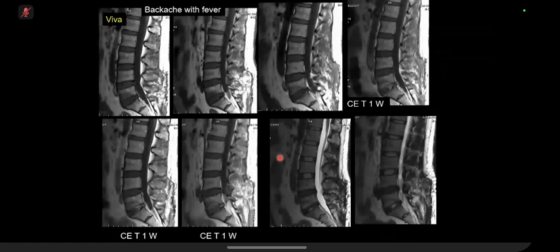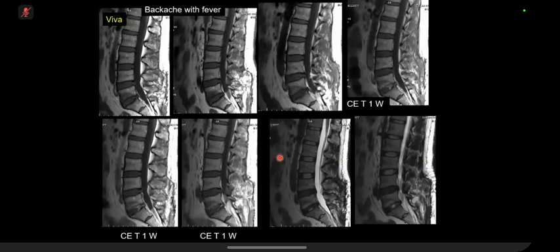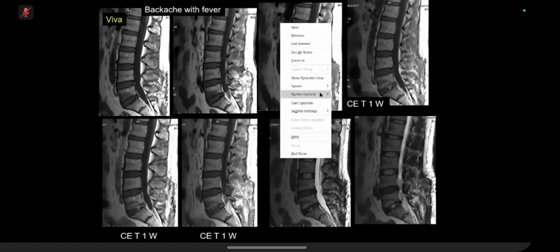So, on the selected images, I can see there's abnormality at the spinous processes at the level from L4 down to L5-S1 level, and there is enhancement on post-contrast imaging. Looking specifically at the disc, I can see there is also abnormal enhancement at the L5-S1 disc material. So what will be your conclusion? Given the patient, this is concerning for spondylodiscitis.